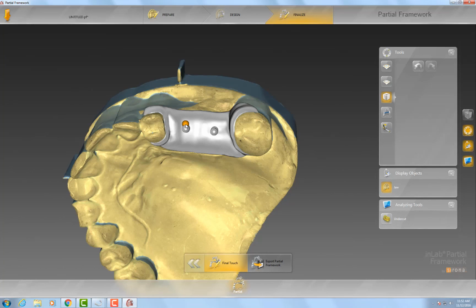But I do know that other companies are making pink polymers and pink pucks, so it doesn't have to be done that way. You can make a PMMA base plate and a PMMA tooth, put them together, cold cure them together, and then there's your little temporary Nesbit. This is also good for implants, to adapt soft gingival tissues. And literally, that's what you do: you just export your framework, boom, and it's done that fast.